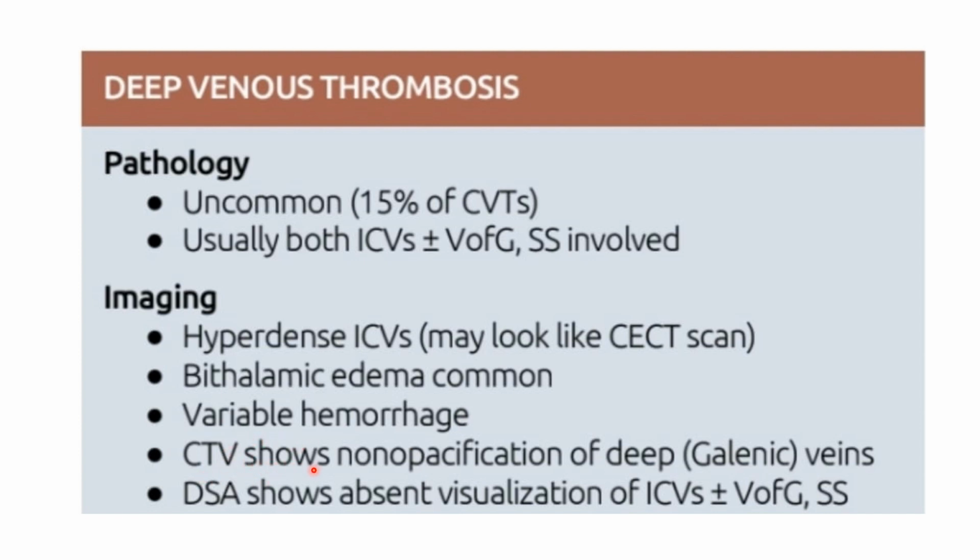CT venogram shows non-opacification of deep veins, and digital subtraction angiography shows absent visualization of the affected veins.